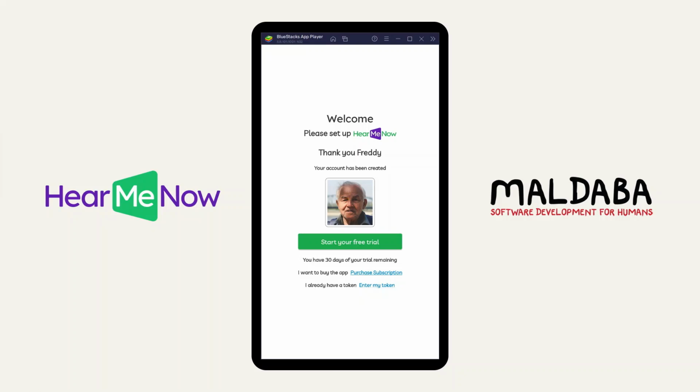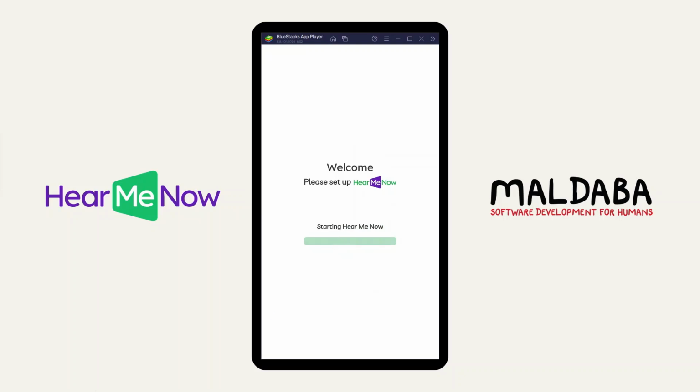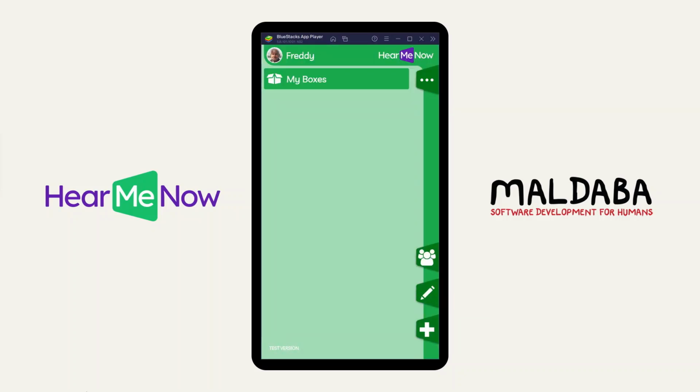As this is a demo, we'll skip over the different options for granting access to Hear Me Now and select Start Your Free Trial, which for Android users gives full access for 30 days. This now sets up Hear Me Now.